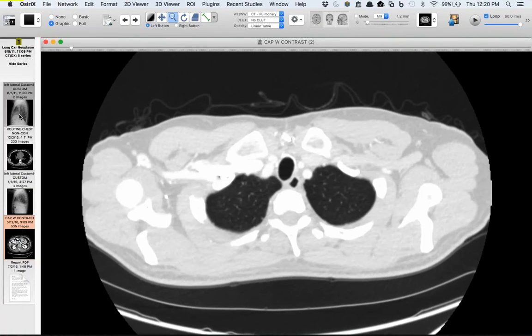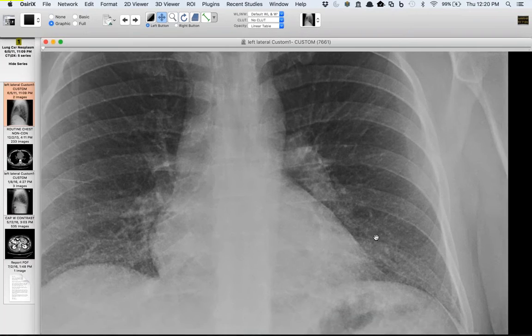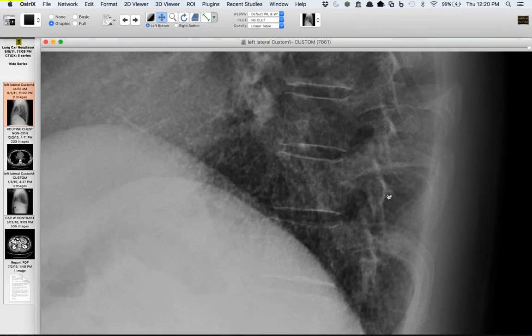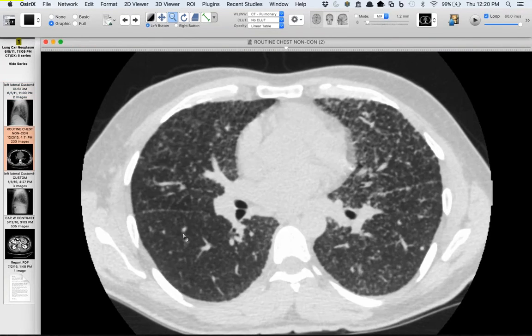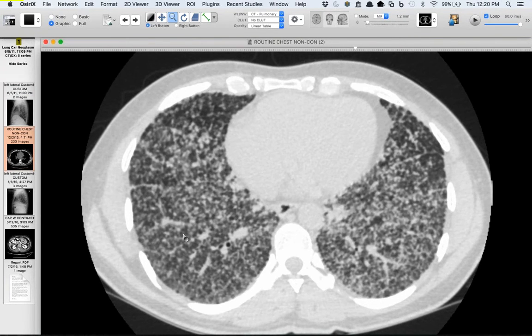But I thought the original radiograph was just a really nice example of these. I think it's a good differentiation of nodular versus reticular, just how discrete some of these little foci are, especially on the lateral view. So, all from metastatic papillary thyroid cancer. So it's one of those ones, obviously, we always think about with miliary or hematogenous metastatic disease, but this is the most dependent distribution I've ever seen of it, and now maybe it's in the lymphatics as well, but it's just quite striking.